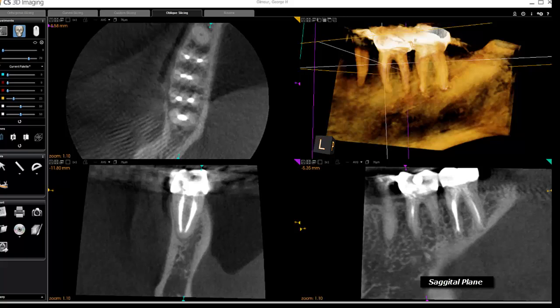Now, there's a high frequency of furcation accessory canals. They exist in the literature, reported anywhere from 15 to 30% frequency. So if this tooth was treated without a rubber dam and the pulp chamber is septic, it's not unlikely that there could be septic transmission through a furcation accessory canal, which could cause some slight furcation bone loss that may or may not be noticeable with clinical symptoms.